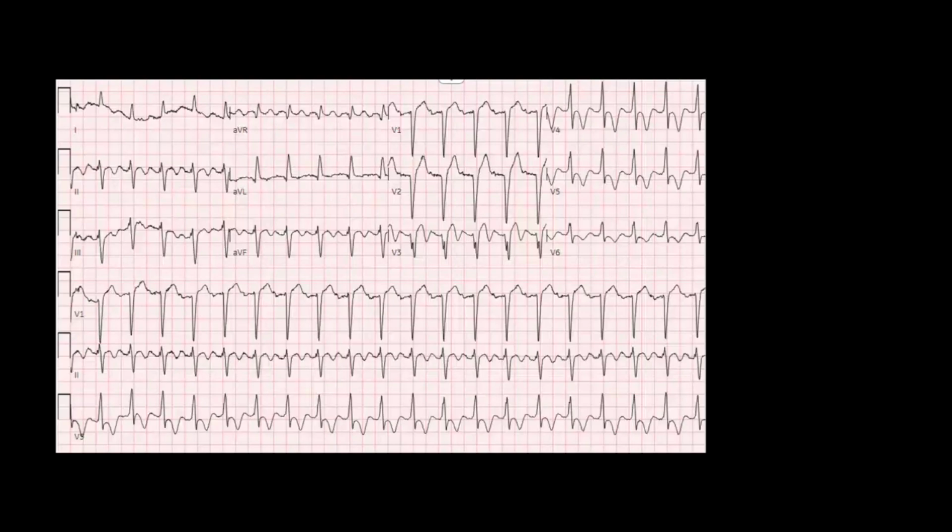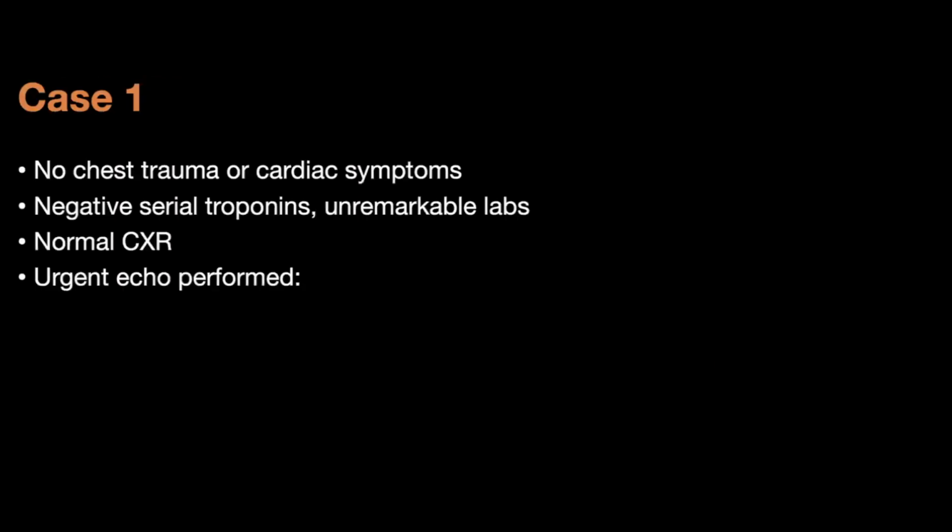This was his ECG. Chris or Jeffrey, just a quick run through: normal, abnormal, and what's the quick pertinent finding? Abnormal sinus with left axis deviation, but the abnormal finding is the deep T wave inversions. Yeah, exactly, these deep T wave inversions.